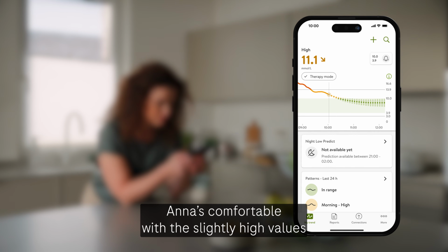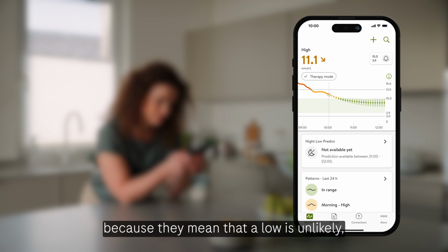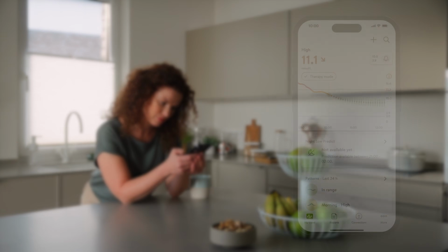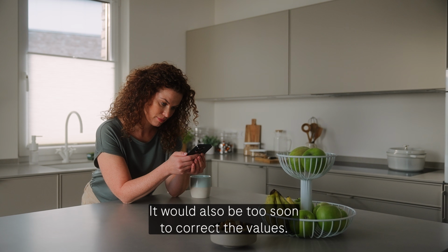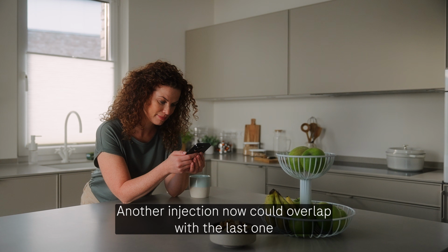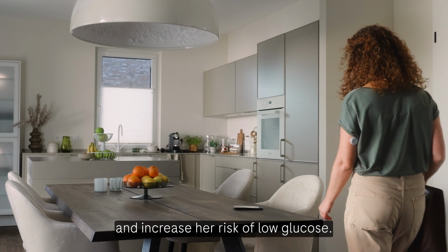Anna's comfortable with the slightly high values because they mean that a low is unlikely, so she should have a safe drive. It would also be too soon to correct the values. Another injection now could overlap with the last one and increase her risk of low glucose.